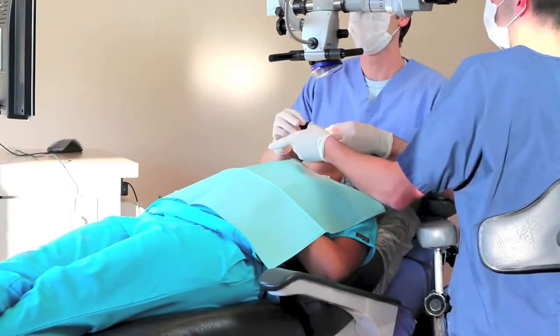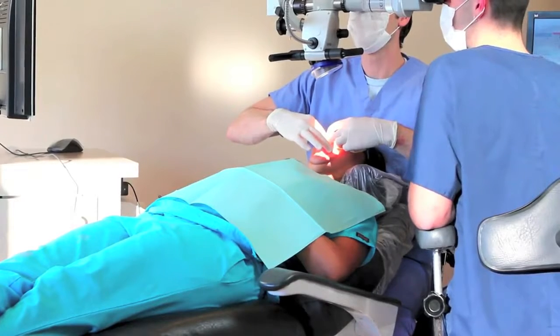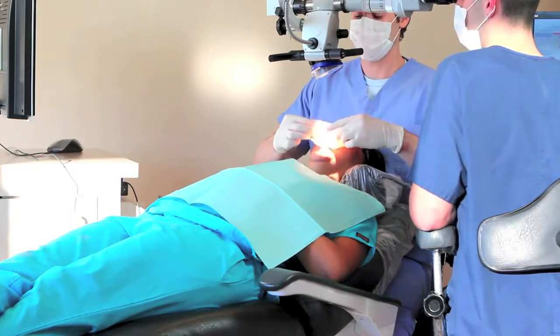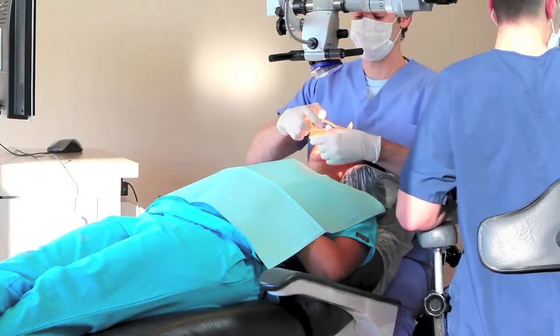In 2007, I had a rubber dam retainer fly off a lower molar tooth and chip a person's number 8. They weren't very happy with me when that rubber dam retainer popped off. So I've learned my lesson, and I'm telling that to you. When you're manipulating that rubber dam in any capacity, make sure you keep some finger on that retainer.